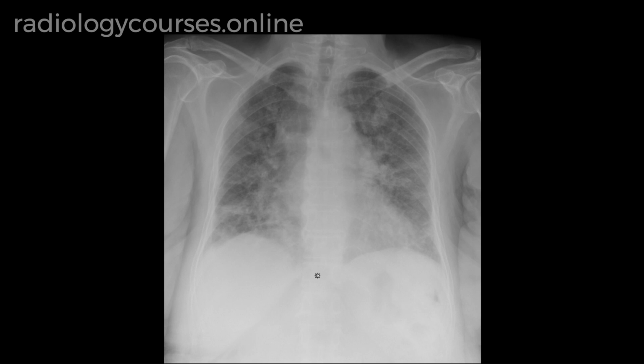The lung volumes appear smaller, presuming the radiograph is taken in deep inspiration. The costophrenic angles appear clear. Despite AP projection, there seems to be cardiomegaly. The hila appear bilaterally bulky or enlarged with loss of demarcation of the hilar structures and the right descending pulmonary artery.